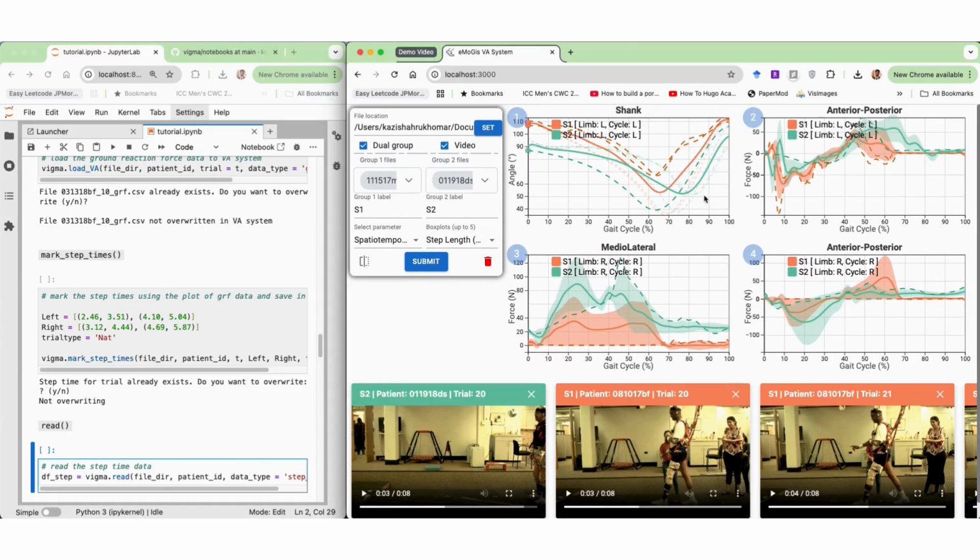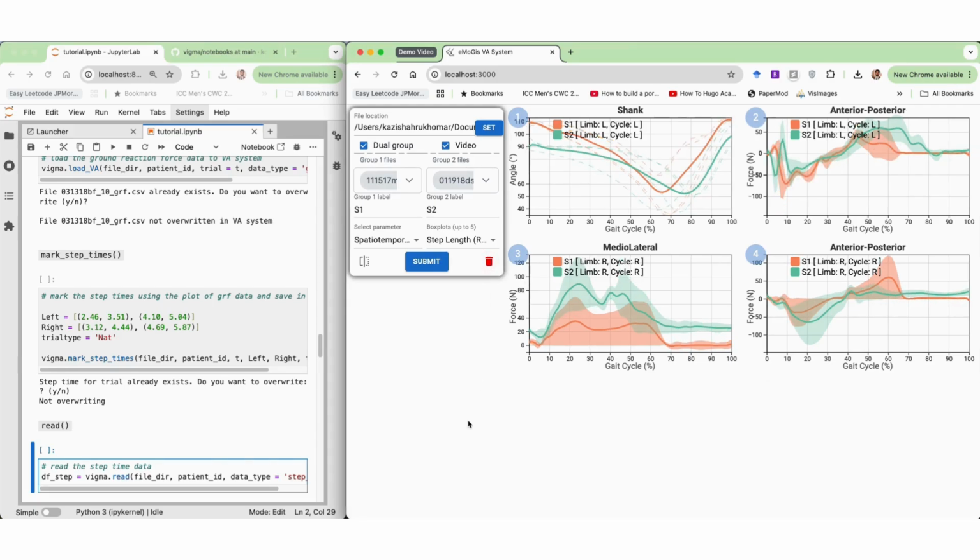We can also see that the visualizations are interactive, meaning that when we highlight over a trial, it shows the actual patient ID and trial number. When we move over the time series ensemble views with confidence interval, it shows the spread values. And we can also remove all the highlights by simply using this reset filter button.